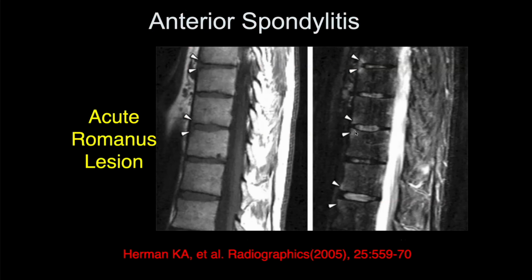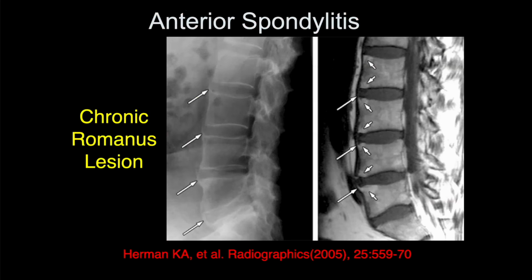For spondylitic arthropathies, later on, you can look for syndesmophytes. Those are very thin, delicate ossification of the anterior longitudinal ligament, which we see here at the disc space levels. These are very difficult to see by MR. These are osteophytes here, which are not syndesmophytes, which we can see here that are being filled with fat. The actual syndesmophytes themselves are this very thin ossification of the anterior longitudinal ligament.